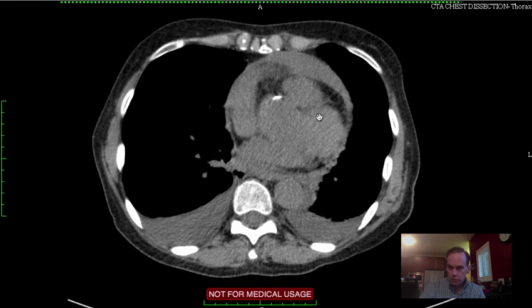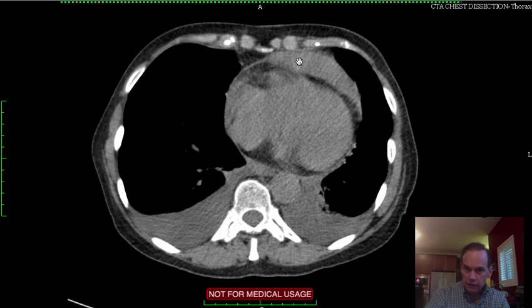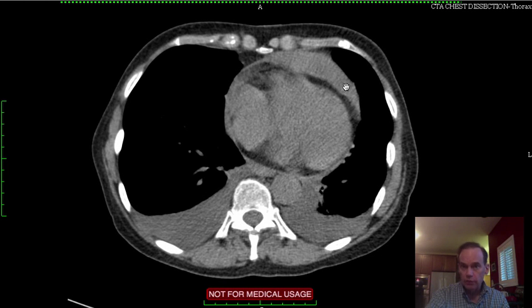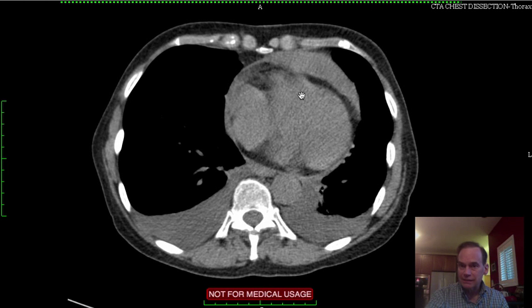So this pericardial hematoma is creating cardiac tamponade of one extent or another by compressing on the heart, flattening it, and disturbing its normal morphology, and particularly its ability to assume a larger relaxed position in diastole.